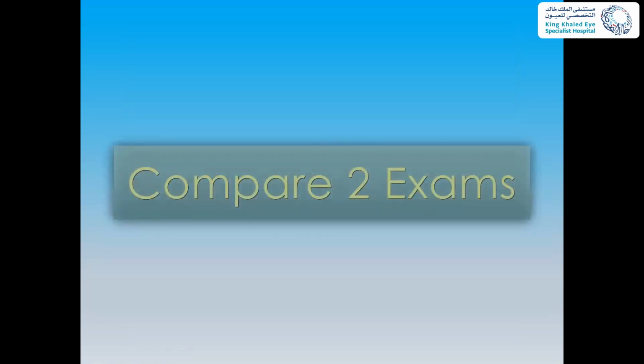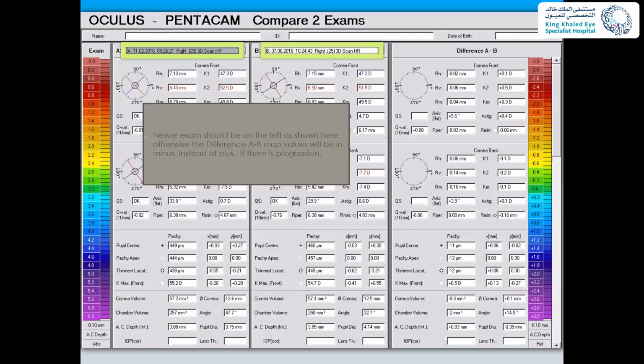So you have to always compare that. You can also compare the 2 exams in Pentacam.